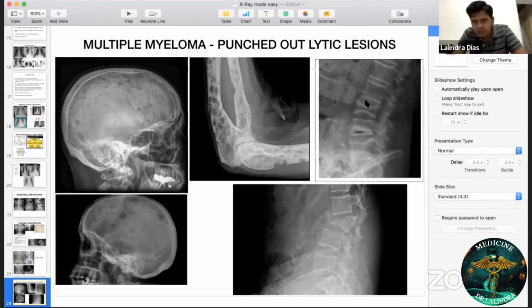So this patient with multiple myeloma has severe osteoporosis and a wedge fracture. This is another vertebral spine. Look at this wedging here. This vertebra is completely collapsed between these two vertebrae, and this vertebra is severely osteoporotic. You can see these white lines, and in between, because what did I teach you? The bone should be completely white, but this is not completely white.